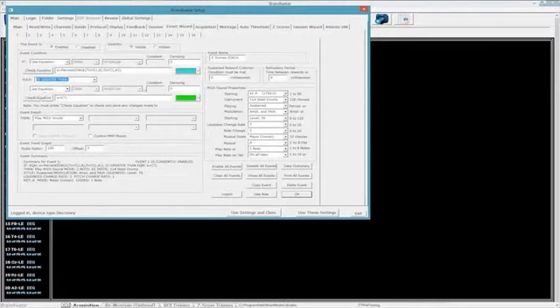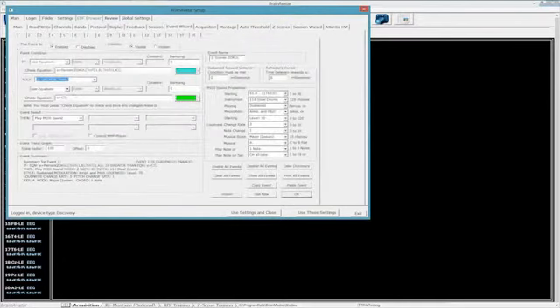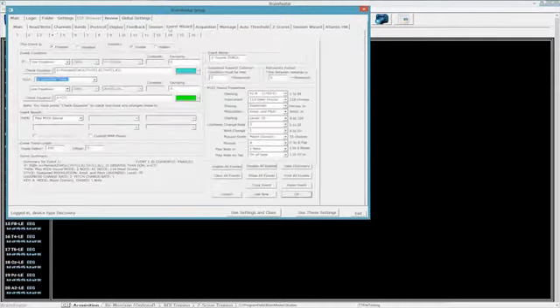So what is that? Well, what are we greater than in here? Here we're greater than our delta threshold. Here we are greater than our variable that we have set up. So, to break down an Event Wizard thing right now, it is literally just this, with some bigger words in it, and there's more flexibility that comes into it.